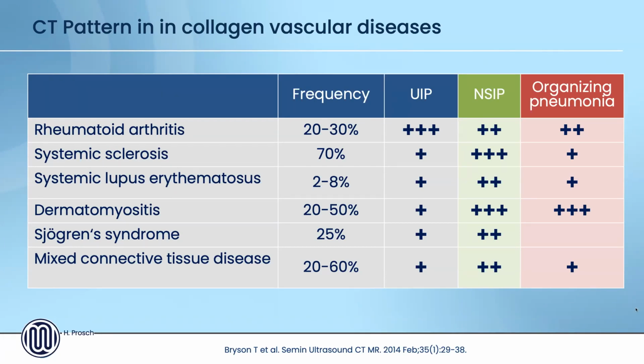Then, okay, the question in regard to tuberculosis. It looks quite different from connective tissue diseases, so this is usually not a big problem for the differential diagnosis. The TB findings are usually seen in the upper lobes, at least in post-primary TB, and the findings seen in connective tissue diseases are primarily seen in the basal parts of the lung.